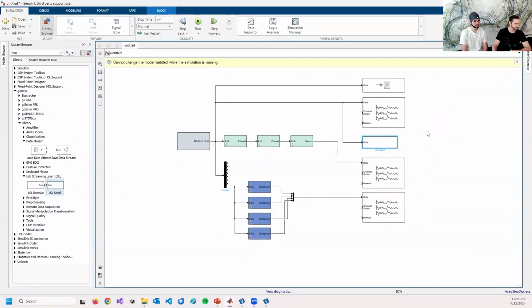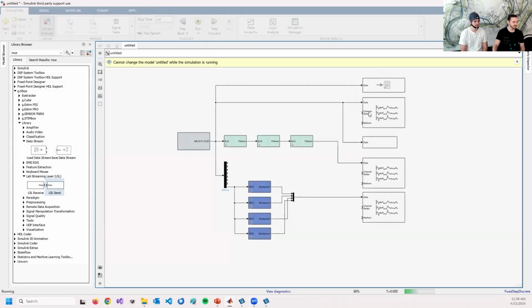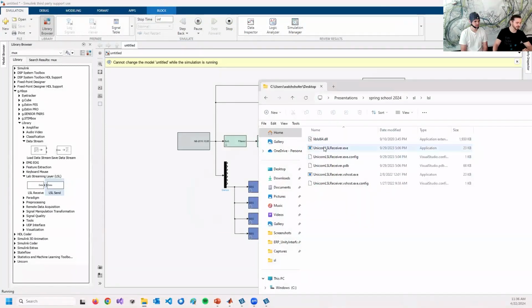All right. And again, I can run the system. Now we're recording data, visualizing raw data, sending the raw data via lab streaming layer, visualizing some pre-processed data, and calculating some band power features in parallel. And to show you how you would receive data in your own application, I created a very simple console application for lab streaming layer.